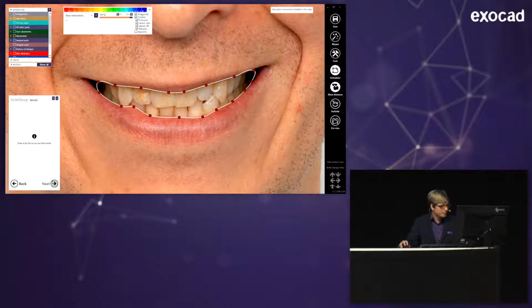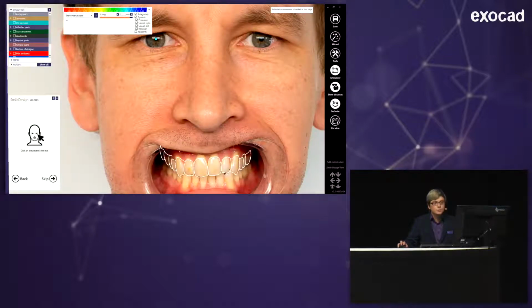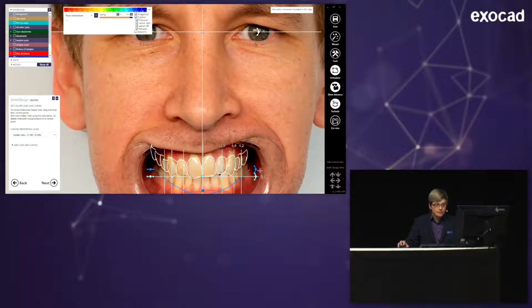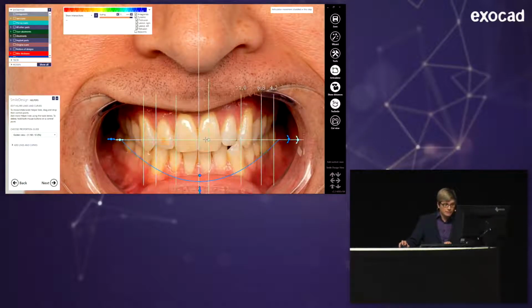OK, so we're back again. So I'm clicking on the patient's eyes, mostly in the middle of them. This will place our helper lines. You've seen them yesterday. You will see down here already our model teeth in an outline rendering. Those are actually model teeth. For now, I'm hiding them because I want to place those helper lines.